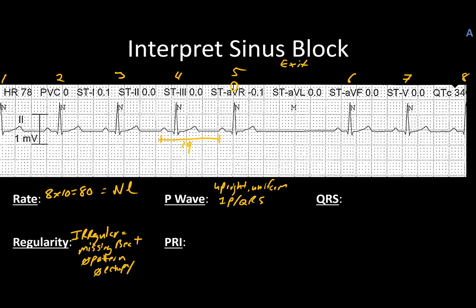And we'll check our gap, which is here, and that is 38. So we can say gap equals 2 times 19, which is 38. So we have that exact match that we were looking for, and that's a good thing.